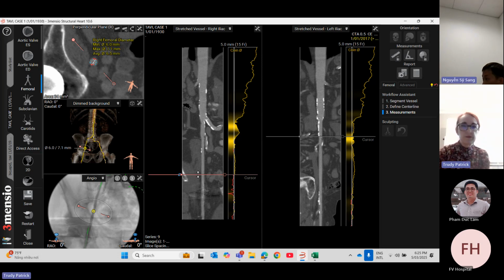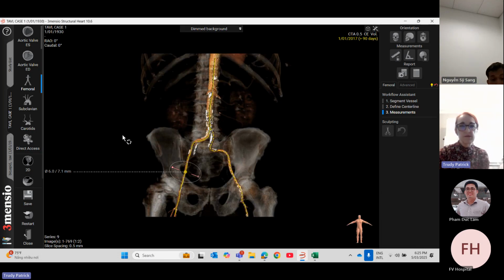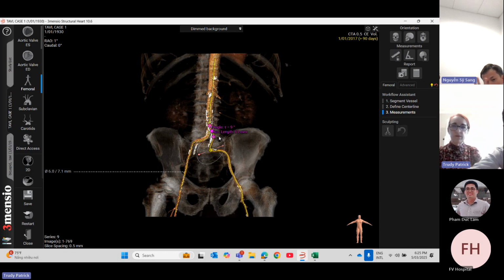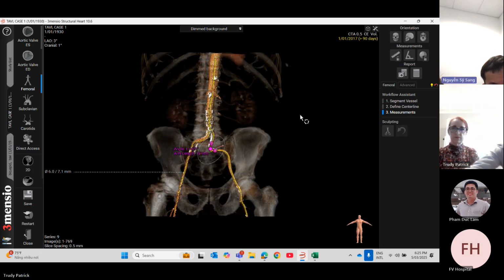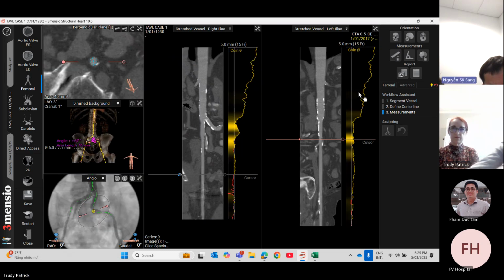And the iliac is easy. Double click here. You can measure the tortuosity angle here. The right click. Yep. Oh, the angle. Yeah, you can see the angles. Tortuosity. Yeah, you do. Spin. You can see the tortuosity angle if it is very tortuous. You can see the angle and measure tangent. Angle measure. Yeah. Angle. Yeah. Spin around.